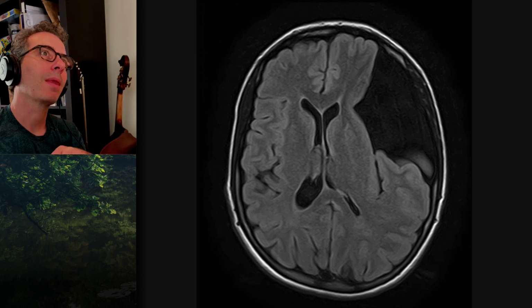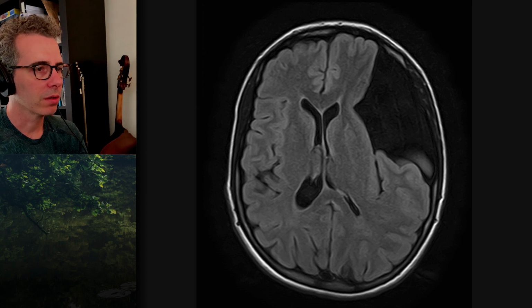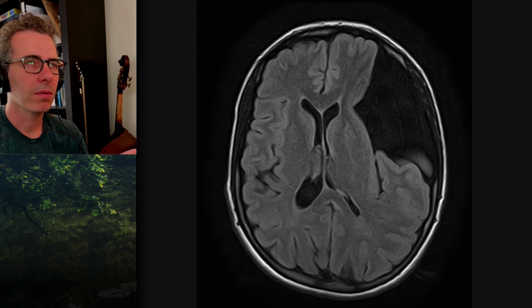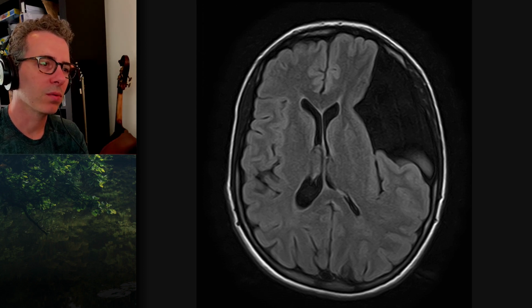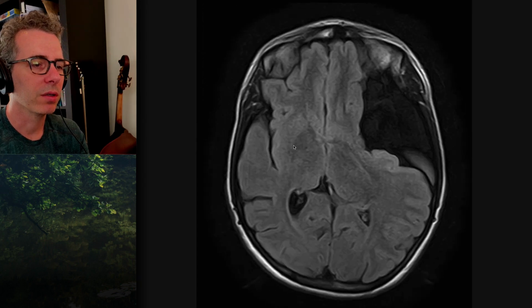So put it this way. Just like flow on T2 will cause signal loss, in those same areas, you won't be able to attenuate the signal completely on FLAIR. So the residual T2 signal, the bit that's missing from T2 due to signal loss, is what will remain on FLAIR as failure of suppression. So this is just pulsation artifact.